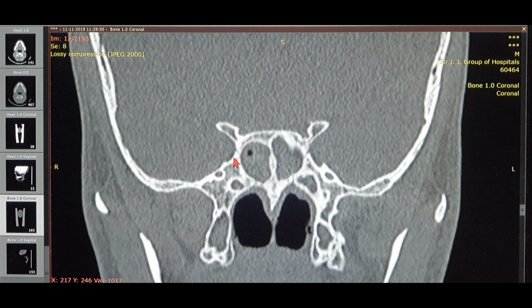And you know that in the cavernous sinus we have the carotid artery, which is right here, as I mentioned some time back. Just lateral to the carotid artery will be the abducens nerve, and somewhere on the lateral wall of the cavernous sinus are the third, the fourth, the fifth one, and the fifth two. See how things fall into place. Now V2, always remember guys, listen very carefully: V2 is the floor of the cavernous sinus. So V2 marks the inferior limit of the cavernous sinus. As you can see over here, this is V2, that's the foramen rotundum.